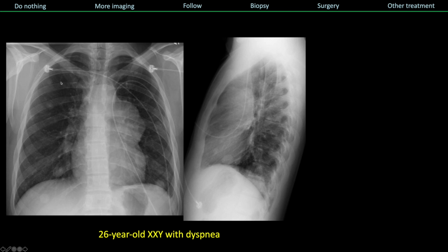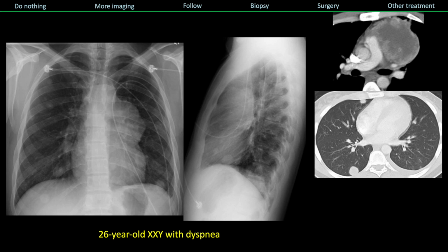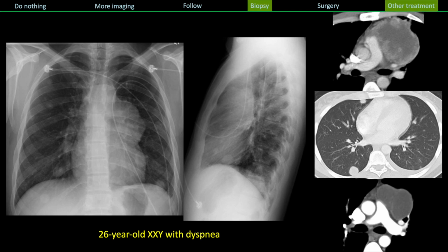But this case is something else, this bunch of Mets, okay, a bunch of pulmonary nodules. So this is a malignant germ cell tumor of the anterior mediastinum, and we got more imaging here, and this turned out to be a sort of necrotic mass with very irregular soft tissue on its borders. It didn't have any of those more differentiated materials like calcium or bone or fat, just soft tissue and fluid in this case. We saw the Mets. This turned out to be a mixed non-seminomatous germ cell tumor on biopsy. We ended up treating the patient with chemotherapy because of the presence of the Mets.